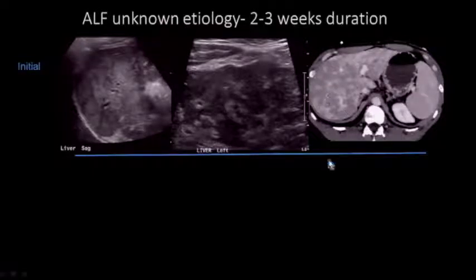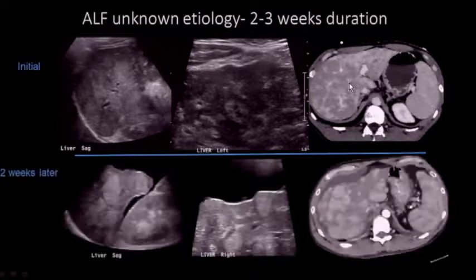The patient had a contrast CT, and you can see there are large, ill-defined areas, somewhat confluent, that are hypodense, and other areas slightly more hyperdense. 2 weeks later, the patient was still with us, and more imaging was done with both ultrasound and CT, and this shows exactly what can happen very, very rapidly. Remember again, these areas are probably the normal areas of liver, slightly ill-defined. By 2 weeks later, the echogenic areas are now much more discrete, rounded, and lobulated, alternating with hypoechoic areas.